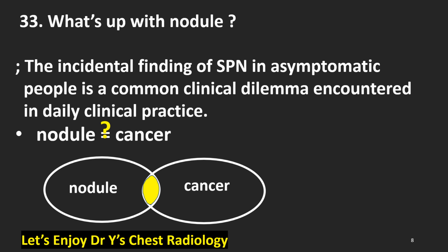What's up with nodules? The incidental finding of a solitary pulmonary nodule in asymptomatic people is a common clinical dilemma encountered in daily clinical practice. Is a nodule the same as lung cancer? No, definitely not. They meet in a small portion, just like this yellow egg, yellow football.